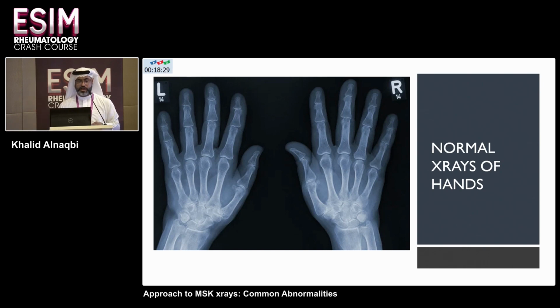You have to look at the other side. There is no calcification in the soft tissue. So soft tissue, number one, no swelling, no calcification. Two, you go to the bone and find if there is any breakage at any point. So we go like this, like this, like this, nothing. And you do the same thing here and say no fracture at all.